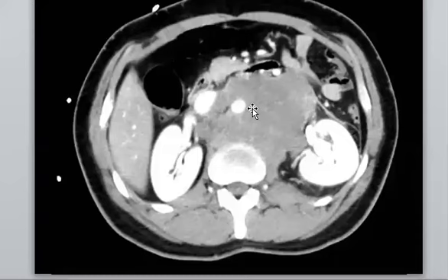Yes, Ala. Why? Because there is another disease in which the aorta isn't elevated, which is retroperitoneal fibrosis. So how do we differentiate between retroperitoneal fibrosis and retroperitoneal lymphadenopathy, as in this case? Because the space between the vertebra, for example, or the retroperitoneal area and the aorta is increased.